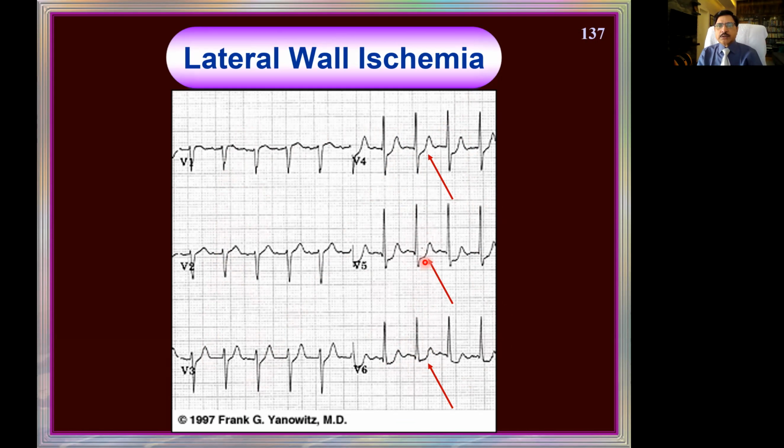It appears as though it is a J point here because of the upsloping, but by the time we came here, we knew it is horizontal. Here it appears like a J point pull or a sort of strain pattern, but we see here it is horizontal. This is also horizontal, and there is 2 millimeters or more in 2 contiguous leads, particularly in the lateral leads.